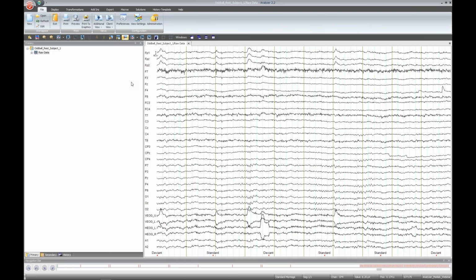By the way, just want to let you know that I have prepared most of the Matlab transformation notes in the demonstrations today to save a bit of time. And to make the notes more visible, I have changed the Matlab transformation color to red. You will see it later.